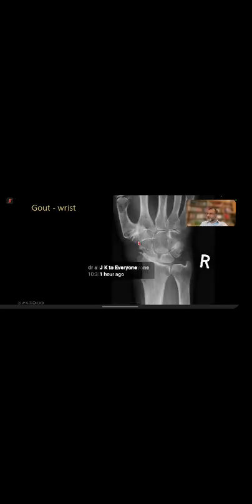Okay, another case. Eccentric erosion, also radial involvement of the scaphoid, and there is a dense soft tissue mass. Okay, so this is, again, of course, we can see calcification of the cartilage in gout as well. Gout also outlines ligaments, can also outline cartilage. So we know that.